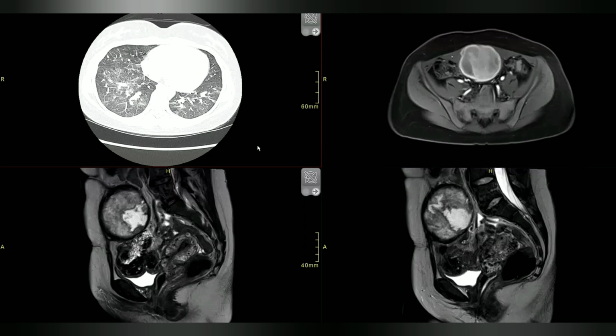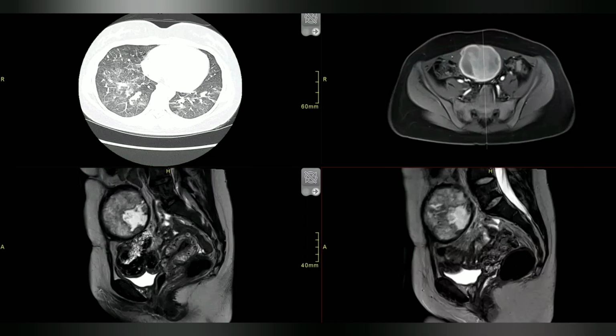So in this patient, what happened is that when they saw these findings, this is not a hematoma. This is hemorrhagic. So that's why you're confusing it for a hematoma. But you saw the vascularity, you saw that it's enhancing. So it's not a hematoma, right? This is the main point to catch. I told you that she's postpartum, so immediately it should come. Okay, it was very good. You said post-op complications. I said, no, she didn't have any post-op complications.